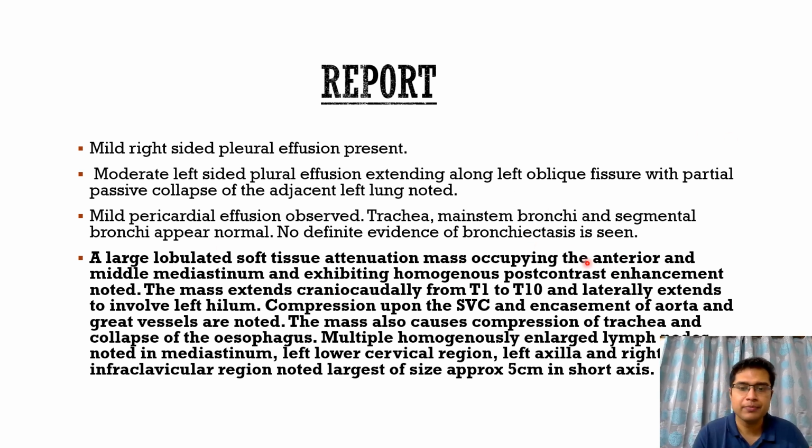and the middle mediastinum, homogeneous post-contrast enhancement, compression and encasement of the aorta and the great vessels. There is compression of the trachea and the esophagus, and homogeneously enhancing enlarged lymph nodes in the mediastinum and the cervical region and the axilla and the infraclavicular region. So the diagnosis here is lymphoma.